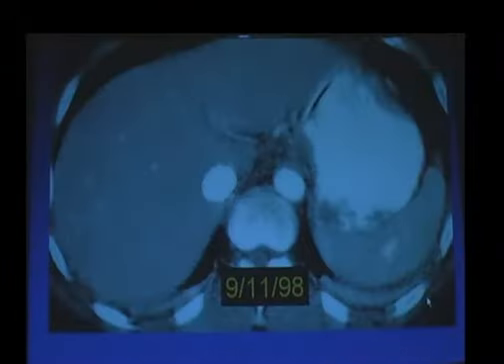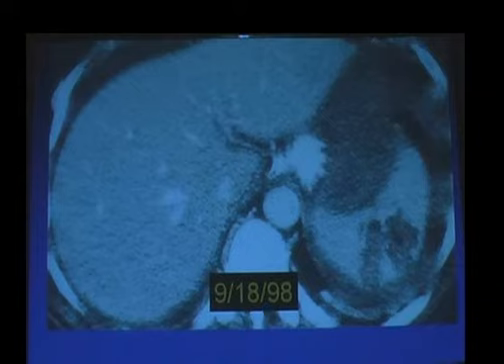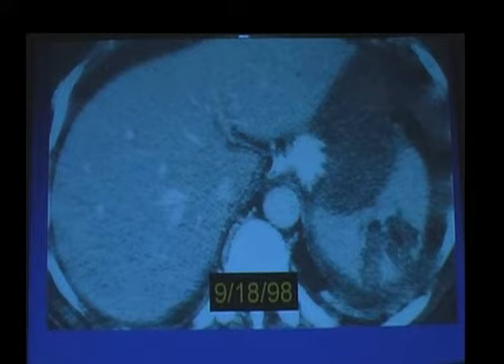This is a case that we had in 1998. This patient came in through the emergency room following blunt trauma, and this was unfortunately read as normal. The patient was discharged from the hospital, but in retrospect, what you can see is this focal region of increased attenuation here within the spleen, and this in fact was a pseudoaneurysm. This patient came back 7 days later complaining of acute abdominal pain. And you can see now that this area ruptured. This patient has multiple lacerations and extensive hemoperitoneum.